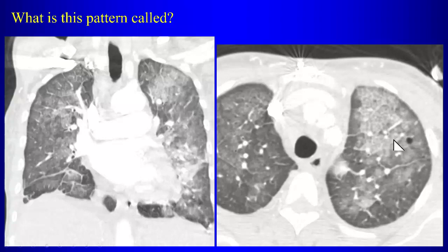Now, what makes this crazy paving is that, yes, you do have ground glass opacity with interlobular septal thickening, but when you look inside the pulmonary lobules, you also notice what? See the reticularity inside the secondary pulmonary lobule, yes or no? Come on, humor me. Yeah, of course, we all see it.